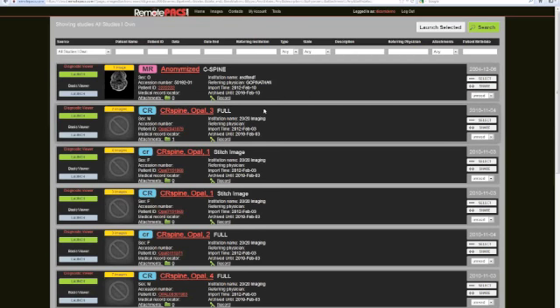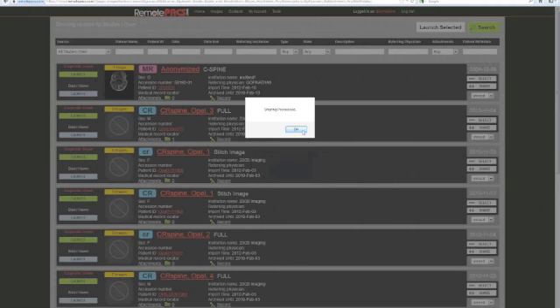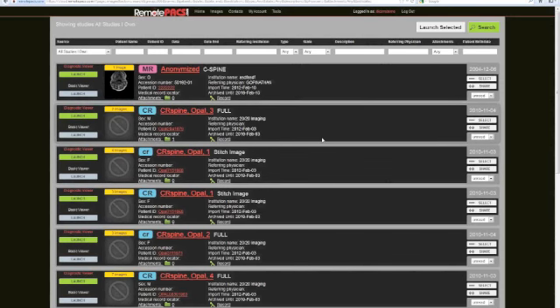If you want to go in and share a study with somebody else so that they can view this exam, you can come right in here, and on the right-hand side there is a button that says Share. Now, we'll get into how we add these contacts in a few minutes, but this is a list of people that I already have connections with. And I can select them, and it moves over here, and I can hit Share Study. That person will now be able to view that study. Now, this is the case-by-case basis.